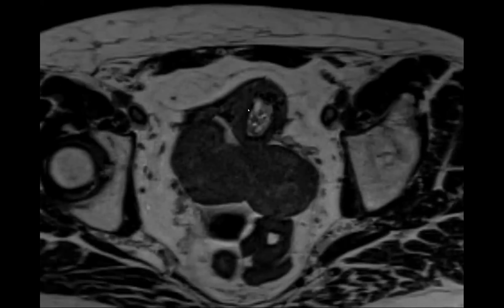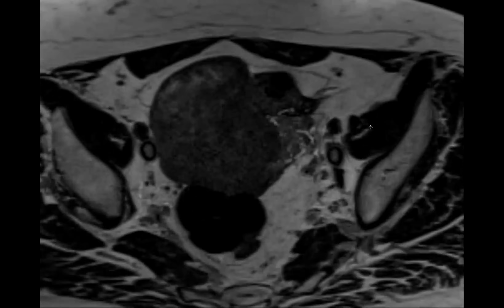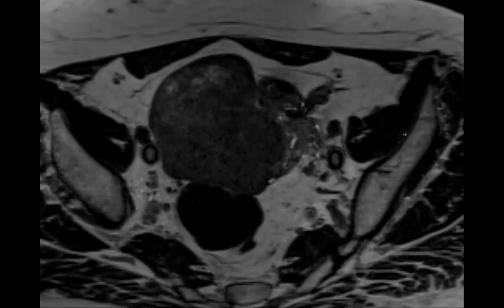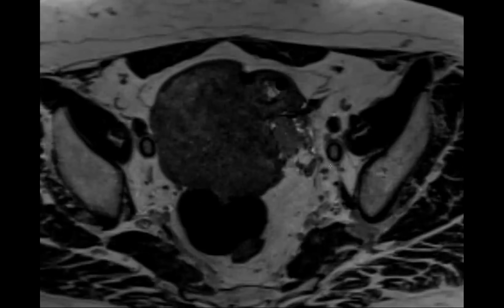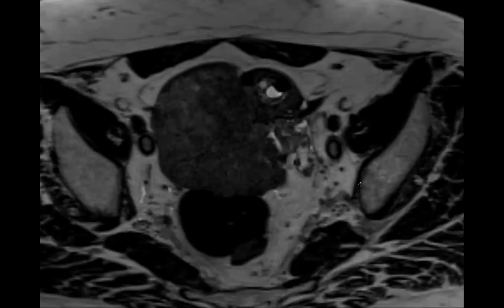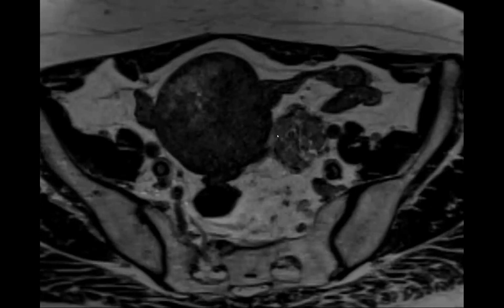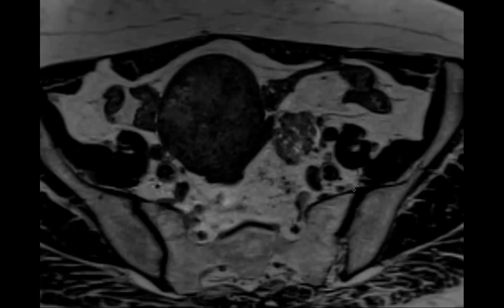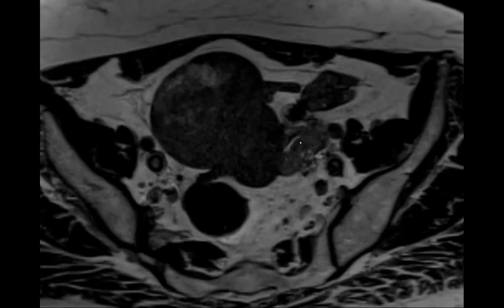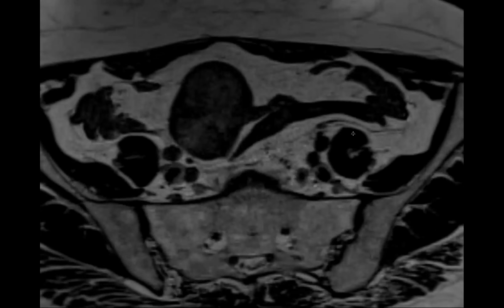Wow, that needs to go on the unknown cases on SAR. What's crazy is that I actually had a torsed fibroma with Meigs syndrome in residency, and I put it in my board review. So now every year at board review, I have this case in there. When I saw this, I was like, this reminds me so much of my torsed fibroma case. And with the effusion, I got super excited about the Meigs syndrome. The part that I got confused by was this stuff, and couldn't put it together. Is this also a fibroid? But in the end, those were just engorged vessels.